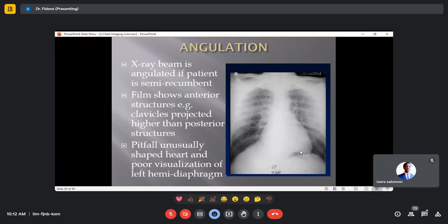Yes, sir. But I told you, you can recognize this angulation by seeing that the opaque areas are symmetrical. There is no difference between the right side and the left side. There is no disease that can be that symmetrical the way it is here. Even the lower part at the bases is symmetrical also. When you see this, you say, okay, this is probably technical.